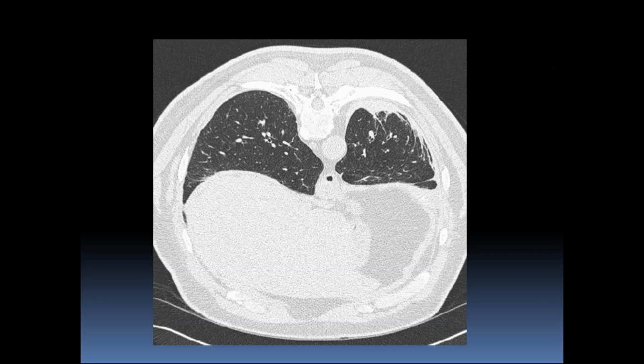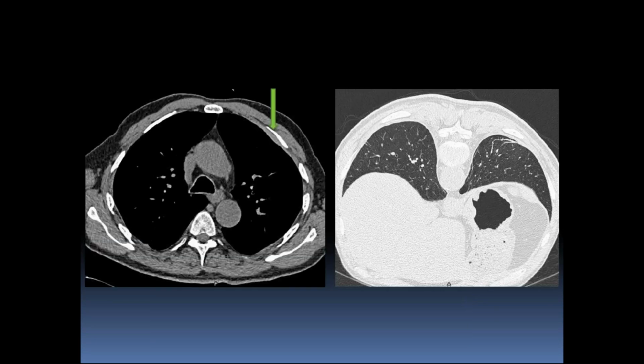If we move into some of the other pleural findings, you can see these subpleural bands. You can see the thickening, and they start to creep along the subpleural margin of the lung. Here's another thickening as well. You can see the thickening on the mediastinal windows, and then a little further down you can see the subpleural bands. Those are all findings where you can say that there is asbestosis going on, because I'll dictate saying either that there's no evidence of asbestosis, or that there are these findings.